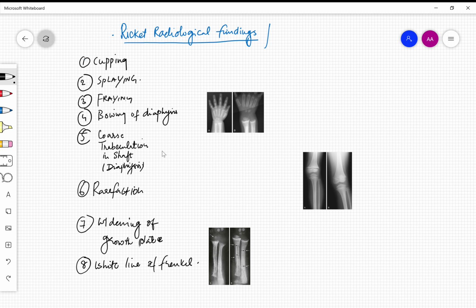Bismillahirrahmanirrahim. Today's video is about the radiological findings in rickets. I have enumerated them as 8, so we will discuss them one by one.